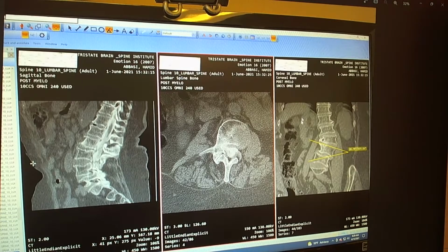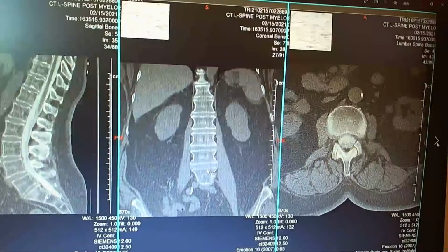Now, here it is higher up in the spine, this structure. What do you think that structure most likely is? This is a little higher up. You see, you don't see the iliac crest anymore, and you see this structure here. Kidney, perfect. Good job. Now, let's go to the next picture. See what else we have here.